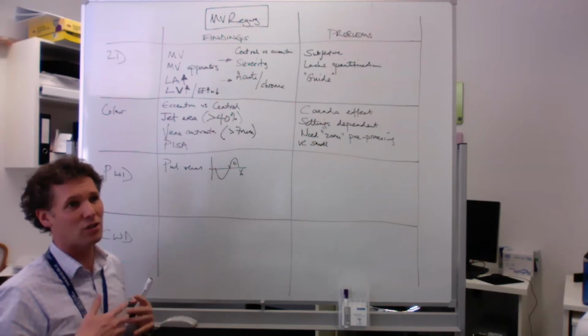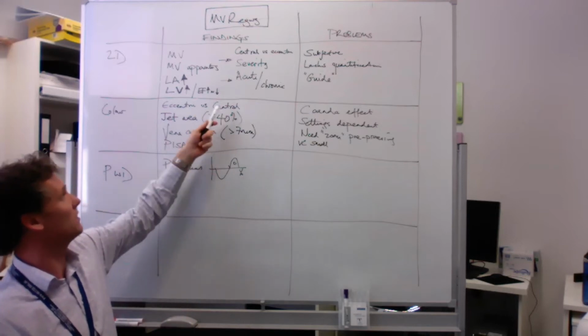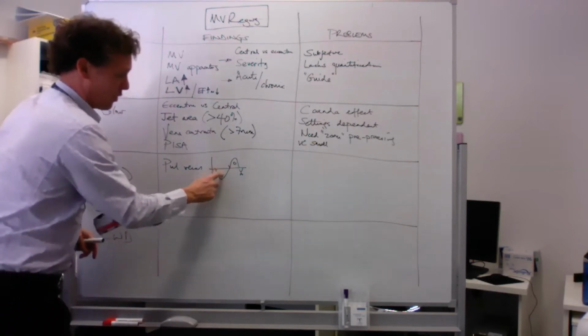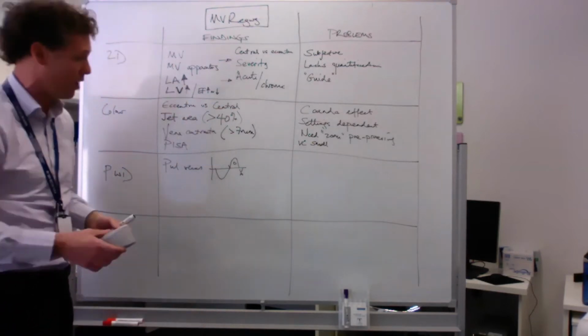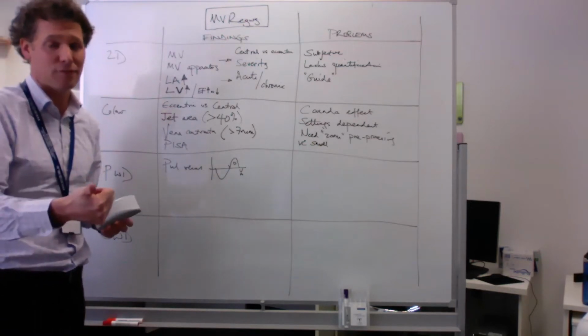It often adds confidence to the diagnosis if you're worried about it, particularly if you've got an eccentric jet and you can't get nice Doppler angles. If you can see your S-wave reversal quite nicely, it points you to severe MR. Just blunting of the systolic wave is good for assessing raised left atrial pressure.